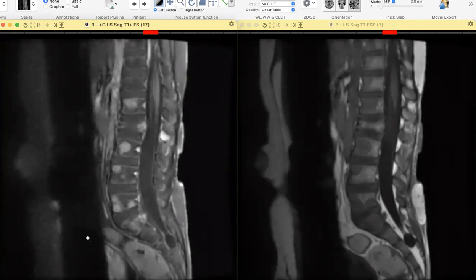In the contrast enhanced fat suppressed T1 weighted images, these areas of low signal show increased enhancement. So the overall findings are highly suggestive of widespread osseous metastasis of the neuroblastoma. So the case will be discussed with the oncology team and the oncology MDT.